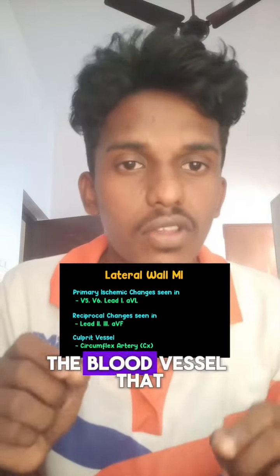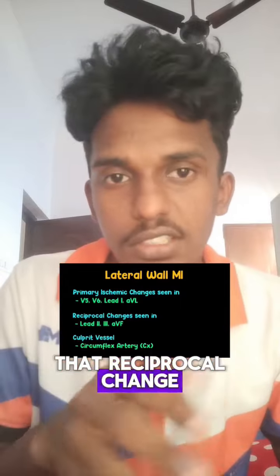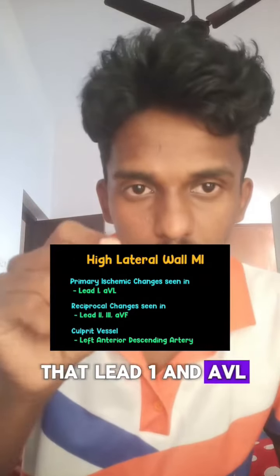Here you can see the blood vessel that is supplying this region, and also please note that reciprocal change. I will explain it later. Now for high lateral, you have to focus on lead one and AVL. Then for apical region, you have to focus on V5 and V6.